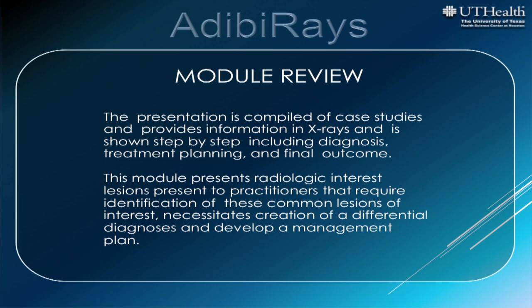The presentation is composed of case studies and provides information on X-rays, shown step by step, including diagnosis, treatment planning, and final outcome. This module presents radiologic lesions of interest that practitioners encounter, which require identification of these common lesions, creation of a differential diagnosis, and development of a management plan.